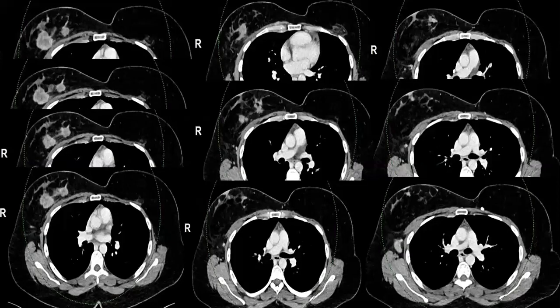And if we look here, have you seen? These are definitely two adjacent big lesions at the posterior breast. Look for the ducts, and this one satellite lesion. Look for the ductal extension here, and look for the ductal extension between the two lesions interconnecting.